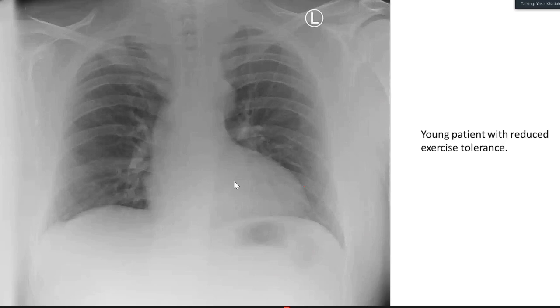Yes, the question is, you have to go further than that. If you think this is a bulge, do you think this is an aneurysm, or something else? Yes, sir, I got it now. There is rib notching noted at the inferior margin on bilateral sides, from the third rib onwards. All right, so you see there's rib notching here. That's the most important finding.